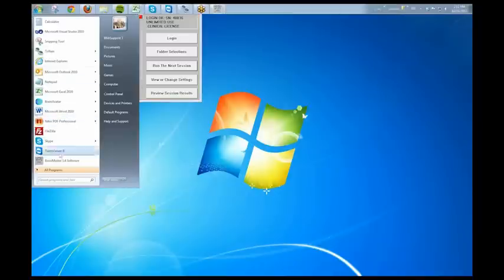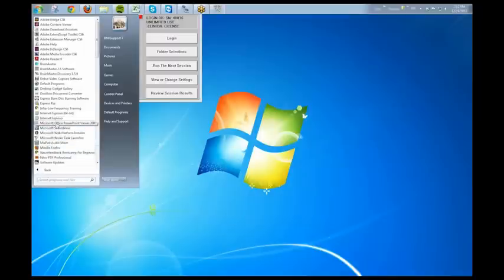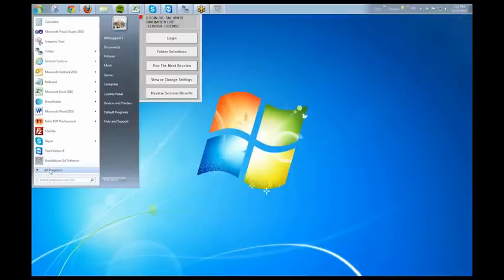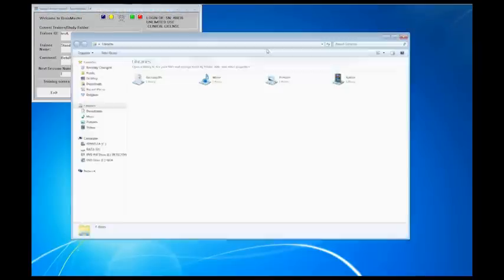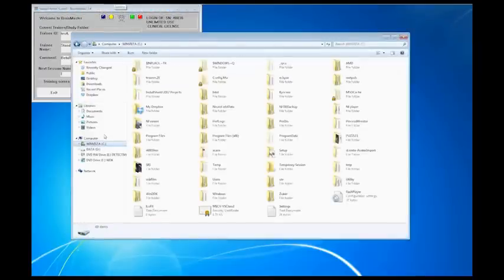Go up here. I'm going to open up my Notepad++ again. You know what, I'm going to open it the easier way. Now, when working with Session Wizard files, it's important to know where they should be saved so that you can call them and have access to them as quick as possible.